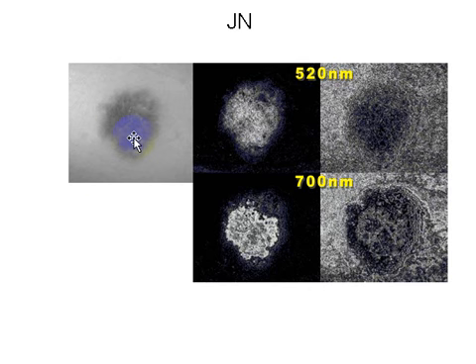between the original picture, algorithm 1 and algorithm 2 is different. When algorithm 1 emphasizes the boundaries, algorithm 2 shows how much the scattering light is more prominent or less prominent, and when the scattering looks hazy and not correlated to the boundaries, I will say that it's not malignant and it's not a cancerous lesion.